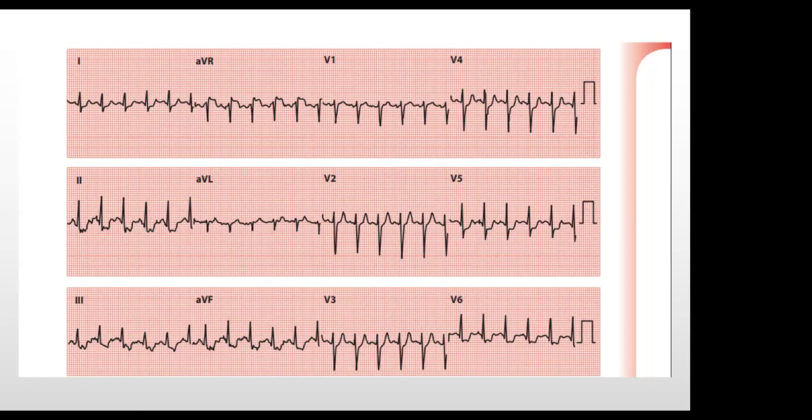Especially if you look at lead 2, for instance, we can see a good P wave, and we can see an ST segment, but there's a P wave here. This is a P wave. This is a P wave. Yes, this is a P wave. But there is ST segment depression here, is it not? Yes, this is depressed, depressed, depressed. You can get some P wave, P wave, P wave.